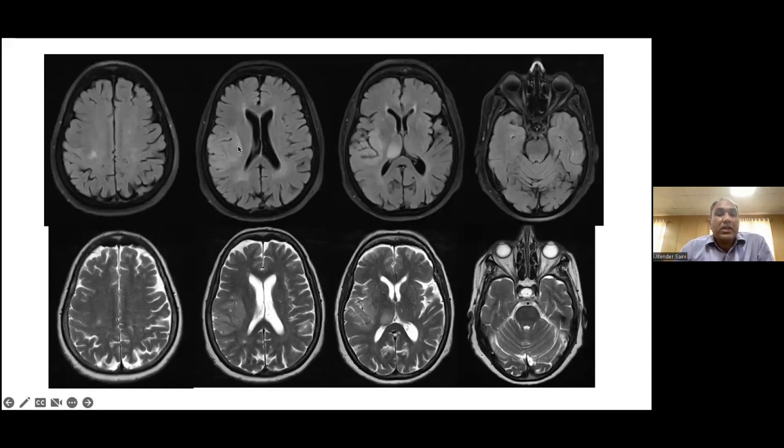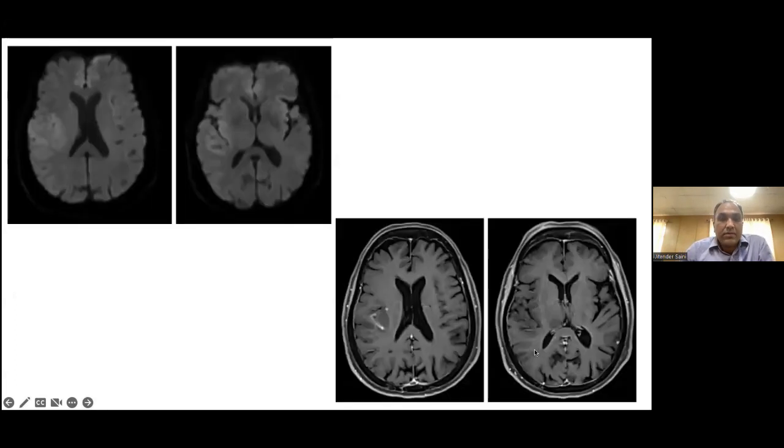You can see that there is some hyperintensity in the right side involving the insula and also the right thalamus. Some signal changes are there, probably involving the cortex, which is much better appreciated on T2 weighted images. Overall, the rest of the brain looks normal apart from some sulcal prominence, but the patient is 77, so it's age-related atrophy, and you can see some cerebellar folial prominence as well.